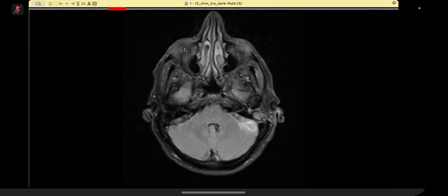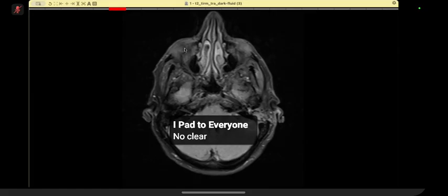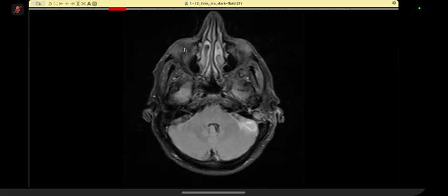The point is that you have made this diagnosis on the FLAIR. You should be saying T1 post contrast. Just think, in the exam, you are reporting it as in your day-to-day practice. Do you report it on a FLAIR that this is an abscess?